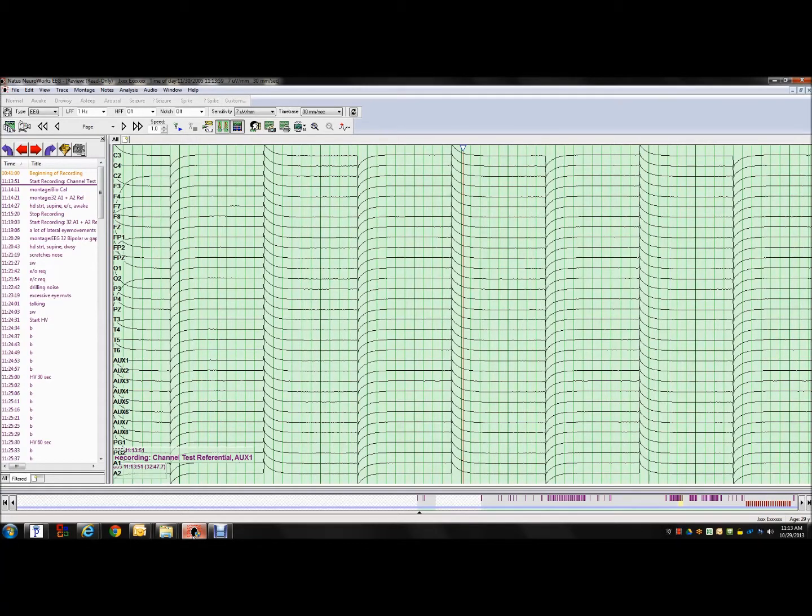But then again, I'm going to go through this EEG very quickly. These EEGs may not be normal, so I also want you to go through and describe whether this EEG is normal or abnormal, and describe why. Okay. So here we're starting the EEG.